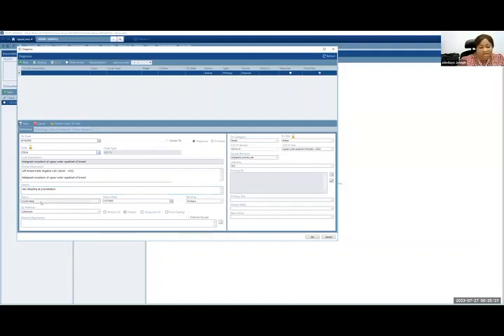The status is asking you what is the status of disease that you are diagnosing here. Controlled means that you have treated it and it is under control. Active means there's active disease going on here. Cured means you are saying that you have cured this patient. Remission means she has had treatment, there's no evidence of disease at this time, this patient is in remission.